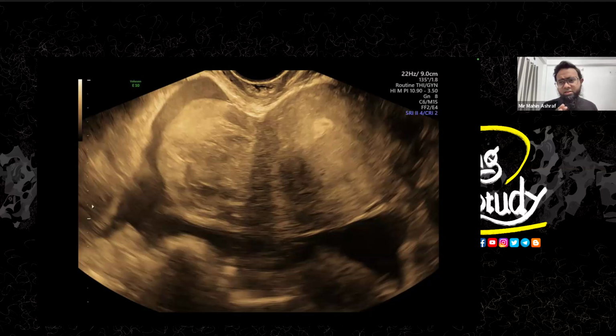In case of confusing cases, you can easily differentiate abscess or cystic lesions. An abscess should have an irregular wall unless it is a healed abscess, because a healed abscess will frequently turn into a cystic lesion. So the abscess will show you the surrounding fat irregularity and fat thickening. With CT we call it fat stranding, and the cyst, if it is not infected, won't disturb the surrounding tissue.